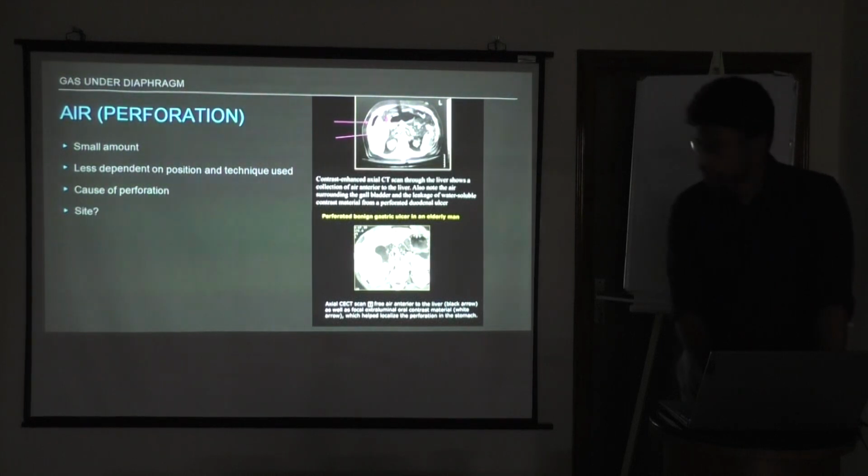In the same way, in the picture you can see this is the gallbladder. There is gas around the gallbladder. You can see the gas in here. This is the typical gas under the diaphragm. But is it because of a perforation of the gallbladder or something else? In this CT, the simple way of seeing things, or how I remember, is you can't see in the dark. Air you can't see. So that's how I remember.